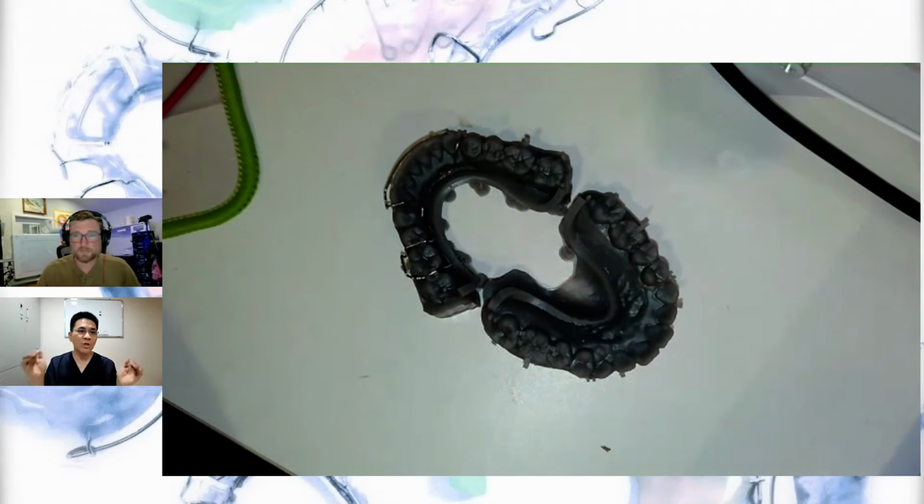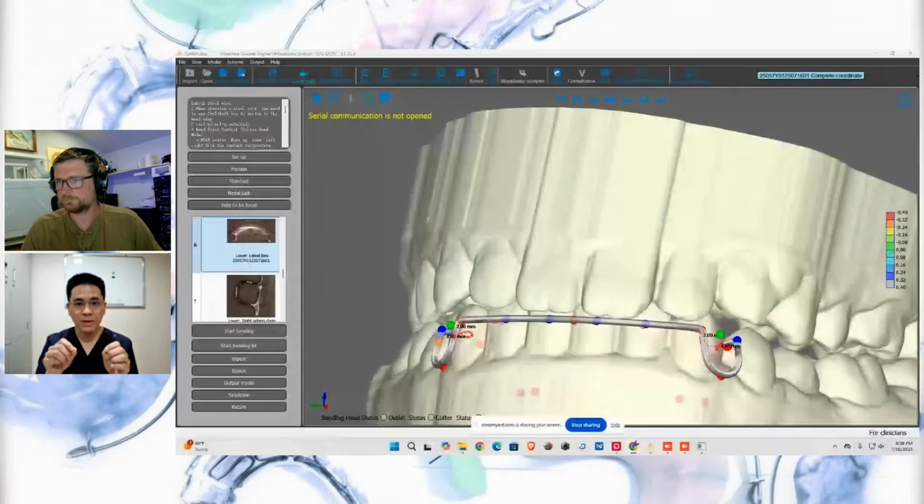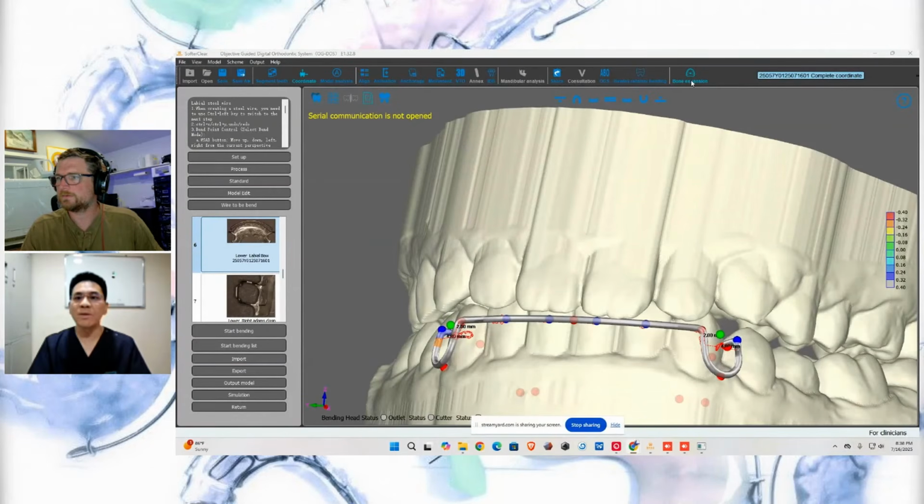Oh, so I saw you can also input the CBCT, yes, to finish the RME, design the marking, output the designed 3D band for the molar, and put the expansion on the arm. So yes, the bone expansion is not released now. We are working on the job.